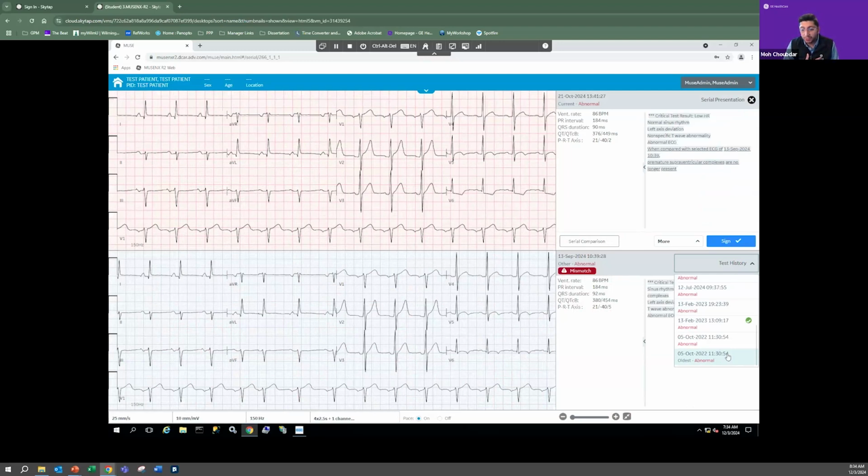If I am in a hospital today, December 3rd, 2024, and the first ECG I ever had was December 3rd, 2010, 14 years ago, then as a physician, you can select it, it will be part of this, and you can do a serial comparison. There is no timeline or limit that we put on that, as long as it's been in our algorithm and it's not from a different ECG card, then you can go as far back as you want to do the comparison.